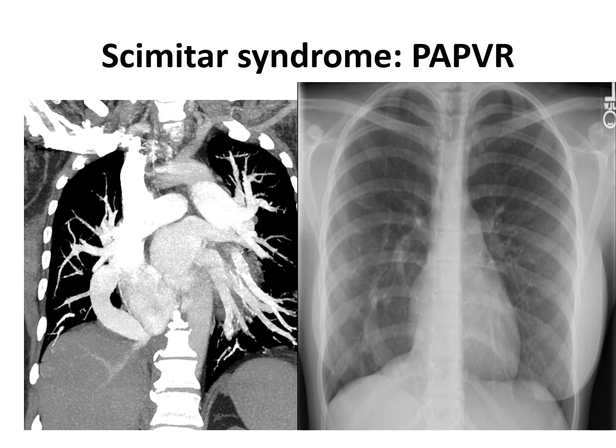There is another very important sign, that is the scimitar sign, which is seen in partial anomalous pulmonary venous return, which is essentially associated with pulmonary hypoplasia, and it is almost exclusively seen on the right side. So we can see here a scimitar sign or scimitar-like appearance in the right lower zone due to the anomalous pulmonary vein draining into the inferior vena cava.